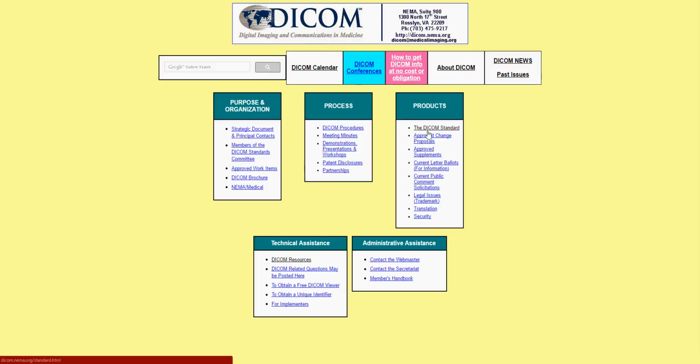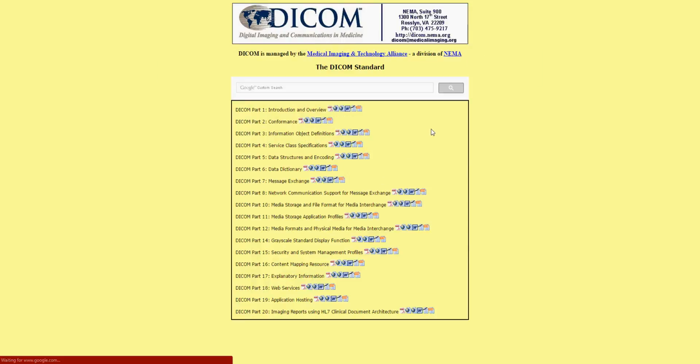For our purposes, to initially understand DICOM data, it's a standard for MRI, CT scans, any related medical imaging, X-rays, things like that. And it's a file format along with the standard that can be used for transferring data over PACS, things like that. So first thing to look at is the data dictionary.